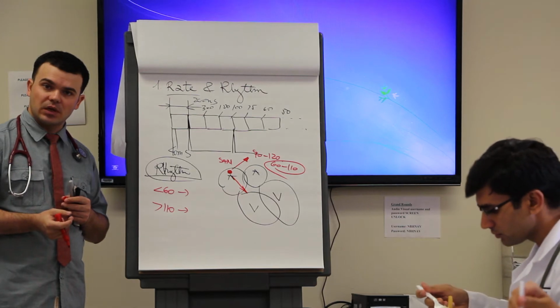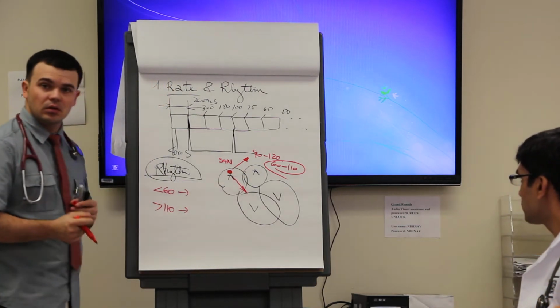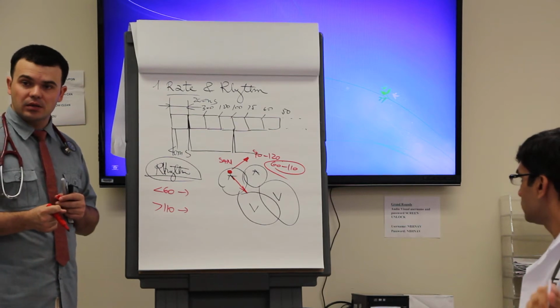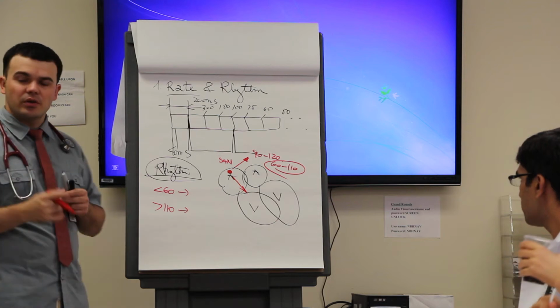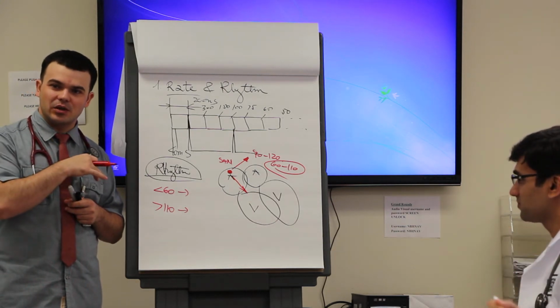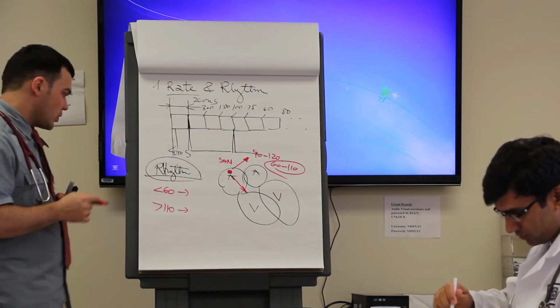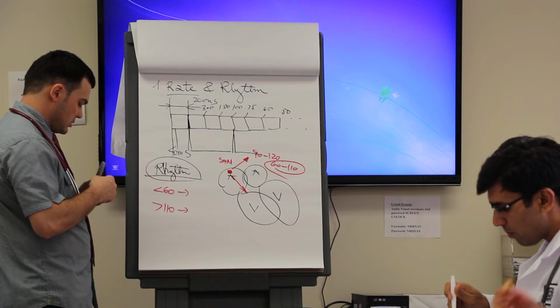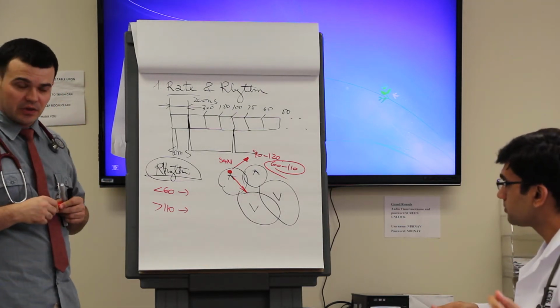So it should be positive in lead 1 and aVF, because it comes down, similar to the QRS. So if it walks like a duck and quacks like a duck, it's probably coming from the SA node, and you can call it a sinus rhythm. As long as you have a P followed by QRS and very regular, that's your likely sinus rhythm.